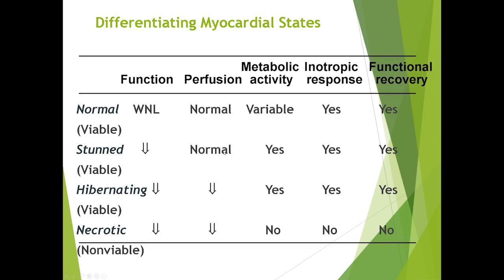So there's actually a lot of variability in the FDG uptake. In order to differentiate what may be normal or abnormal uptake, there are certain things one can follow. So one has to know what the perfusion pattern is. So really you can't look at the FDG alone. You have to know the function, you have to know the metabolic activity, and putting all that together will help you determine whether or not you'll get functional recovery.